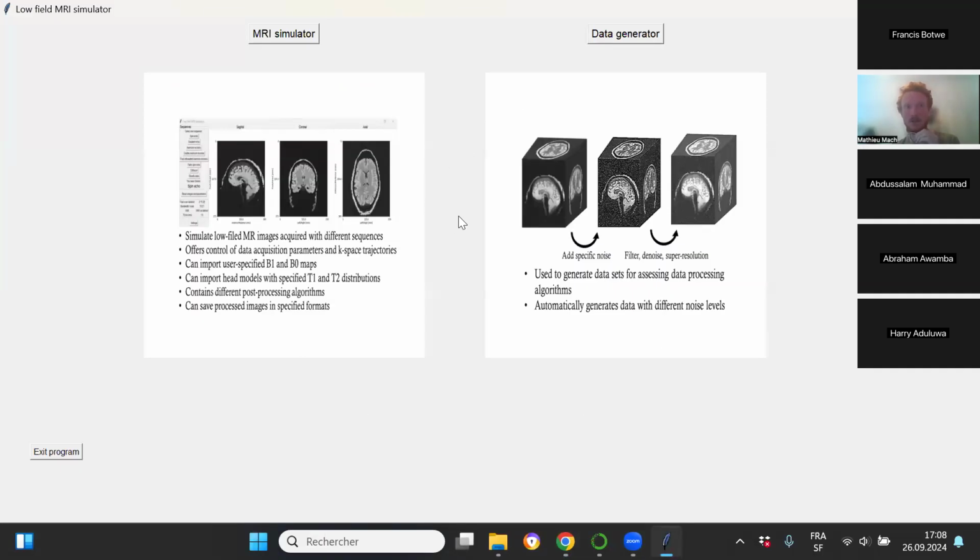Do you see what I'm seeing? The simulator, or are you still on the website? We can see the simulator. Okay, you can see the simulator.